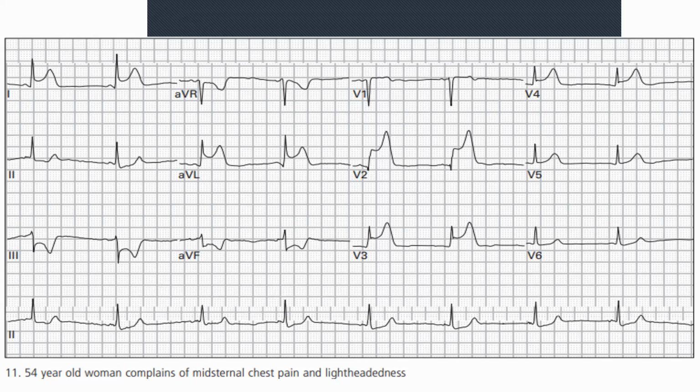So it's quite strange, because your heart rate here is not very fast. Counting 1, 2, 3, 4, 5, 6, 7. What's 300 divided by 7? Anybody know off the top of their head? It's quite slow, about 60 somewhat. So that is a bit strange. Even if you don't know exactly what's going on, number one, the atrium and the ventricle are passing signals along too quickly. And even though the signal is going along too quickly, the heart is supposed to react very fast as well. It's not. It's carrying on at a normal, actually slightly slow, pace. So there's something going on. But even if you don't comment on all of that, that wasn't the main thing. Even if you could just say something looks abnormal, that's fine.